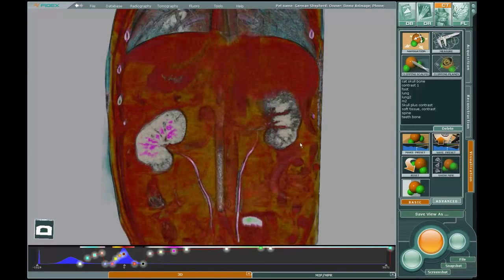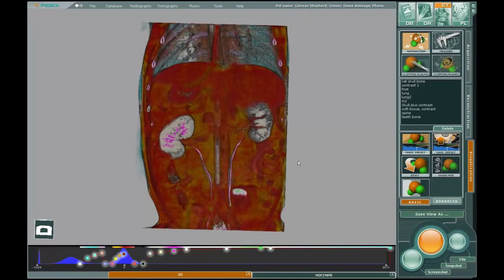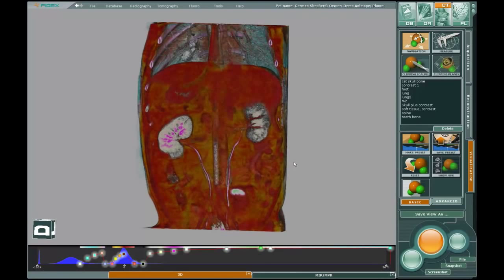Volume rendering will make colorful, almost lifelike semi-transparent images of the scan volume. This is achieved by mapping density values, as shown in the blue histogram on the bottom, to color and opacity. For example, bones with high density are typically shown white and opaque. The lung tissue, which is low density, may be light blue and transparent. This opacity function is given by templates on the right screen. You can change them in various ways.